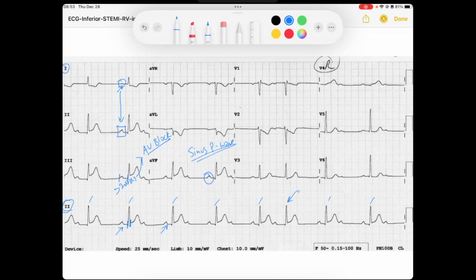And if you notice, as we evaluate sequential PR intervals, we'll take a look and we'll see I've actually got these P waves that are, you can see almost a P wave kind of buried in there that seem to be occurring without a QRS. And the PR intervals, if you look at this one, is very long compared to this very short PR interval. So this makes me think maybe this isn't just a simple first degree AV block. Maybe this is a higher degree block.